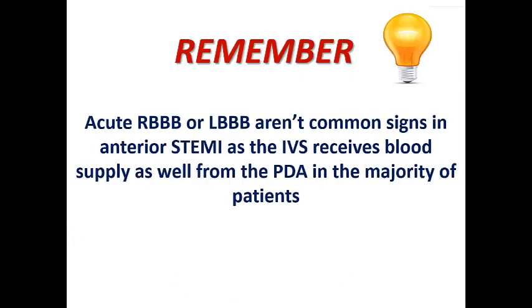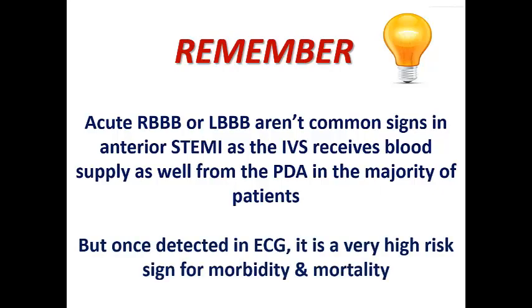So remember, acute right bundle or left bundle branch block are not common signs in anterior STEMI, as the interventricular septum receives dual blood supply. But of course, when it occurs in some patients, it gives us a clue that the LAD occlusion is very proximal with a worse prognosis. And once detected in ECG, of course, it is a very high risk sign.